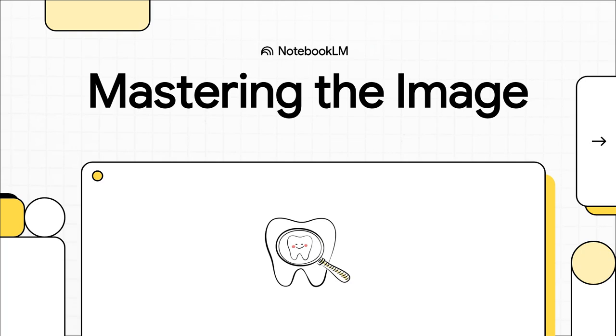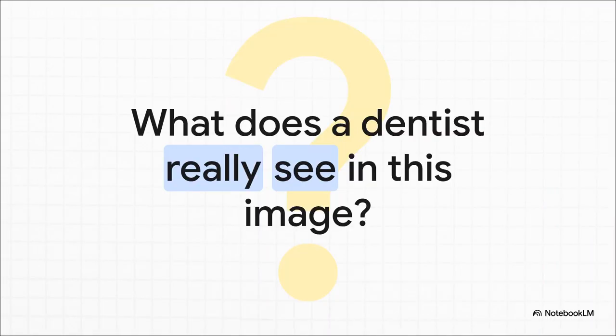All right, today we're going to do something a little different. We're not just looking at dental x-rays, we're going to learn how to actually read them. We're going to decode all the little secrets hidden in those shades of gray and see how these simple shadows can tell us a whole diagnostic story.